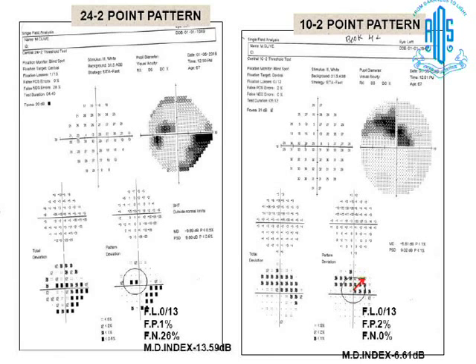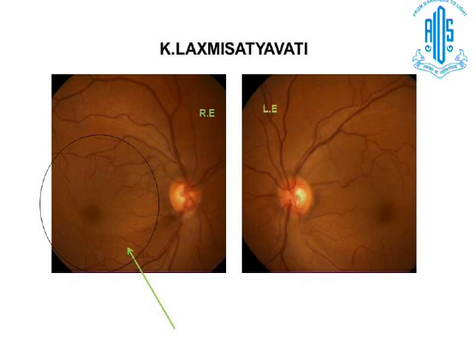Suppose you see the retinal sensitivity is about 13 or 11, don't miss taking 10-2. If you see a black square, that means here I am not able to see. Then you see this patient. I told you about the suspected glaucoma where I showed corresponding changes.